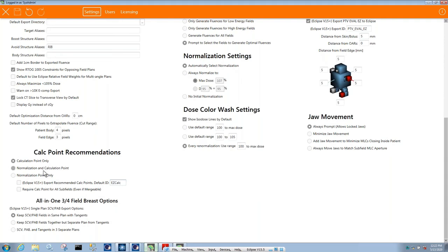Where those points are, or how they're selected: EZFluence chooses a location that is, one, close to the 100% isodose line, and two, not on any large dose gradients or Hounsfield unit gradients, and three, it tries to put it in an open location where all the fields behave well for field-in-field, so that point will pass in Clear Calc or Rad Calc or whatever your secondary check is.